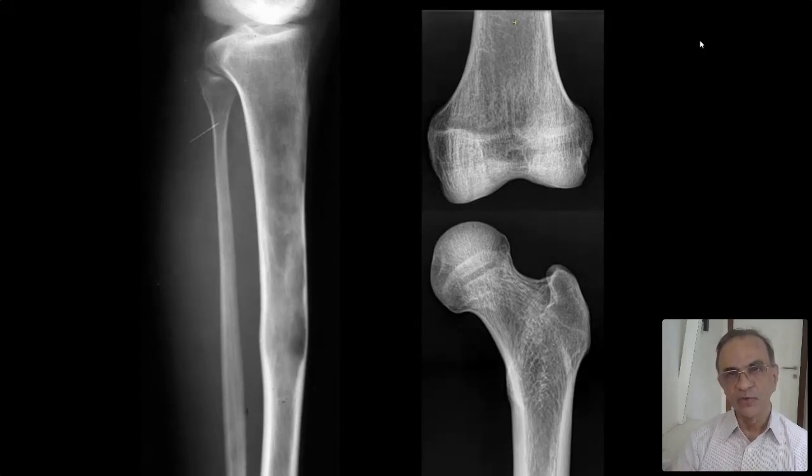I'm showing you this because this is the one that is difficult to understand in radiography. And this is the one that can create confusion between metabolic bone disease and skeletal dysplasias, right? So when you see ground glass opacity, that's the word I want to use, you know that this is a particular entity, which is a skeletal dysplasia. Okay, no names now. This is just ground glass opacity.